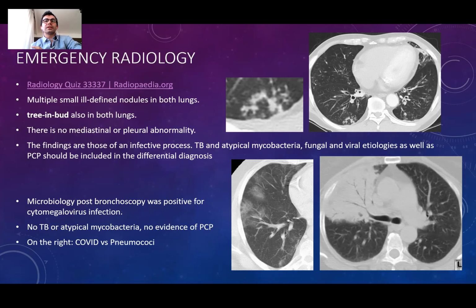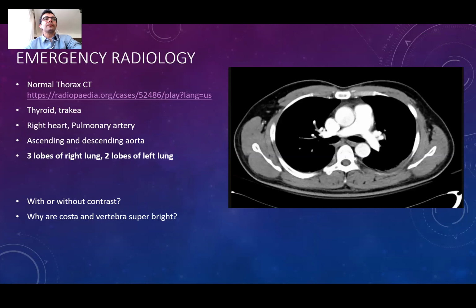So as we are seeing, we were thinking of the patient as mycobacterium. Even they asked me about this, but the diagnosis was cytomegalovirus. So it's not always possible to look at the image and nail the diagnosis, but we can have an idea about the general infiltration pattern. We will come to this on chest X-ray. This was just a small entry of that.